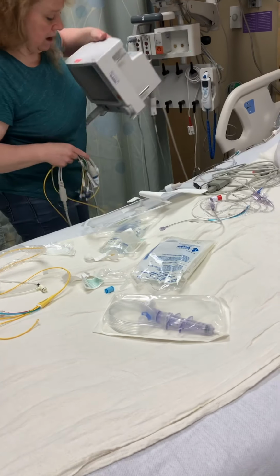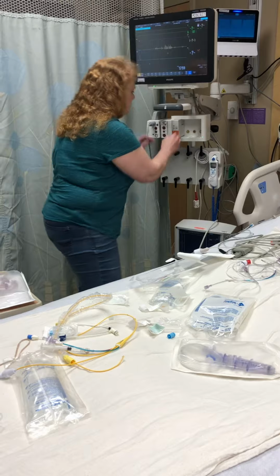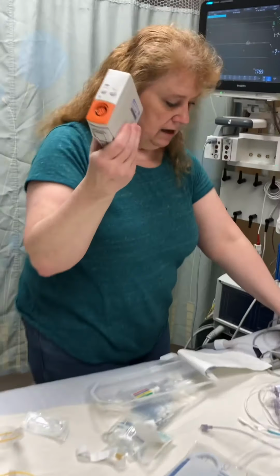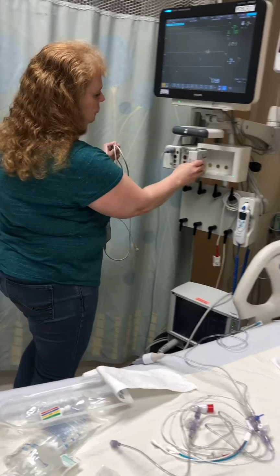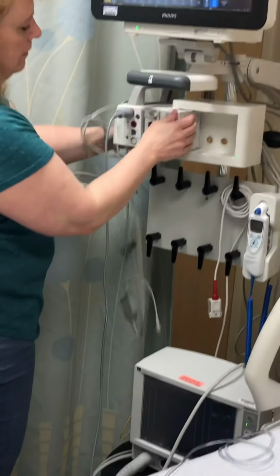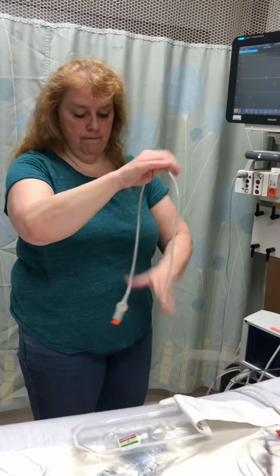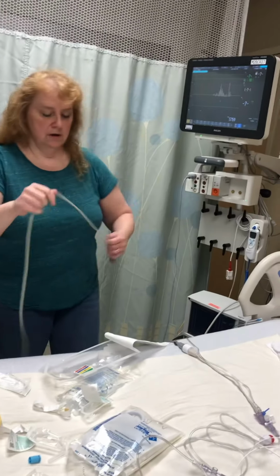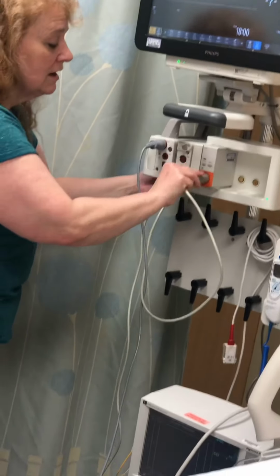Get this out of the way. Our manual, you need some different equipment. So in our manual, you need this that you get in our supply room. This fits into our monitor here. Just snaps in. And then you need a cable. The stuff is orange, so look for your orange. Orange goes to orange, nice and simple.